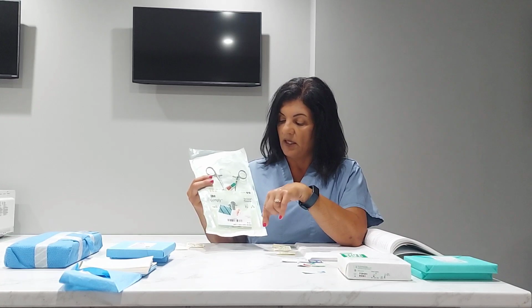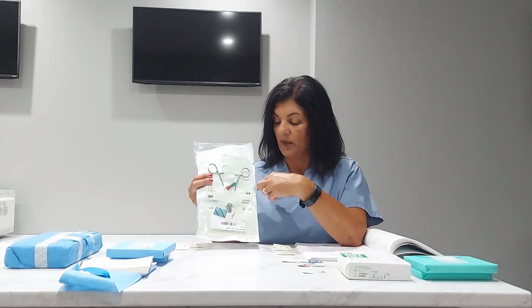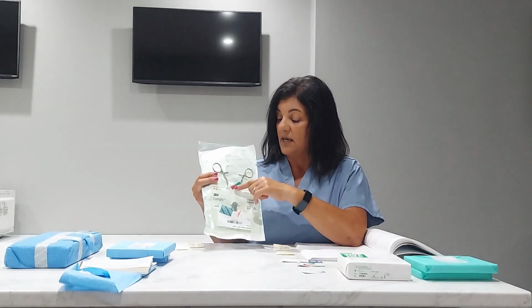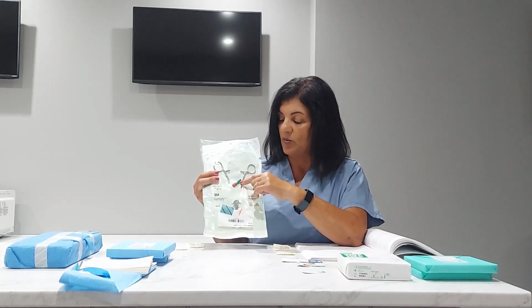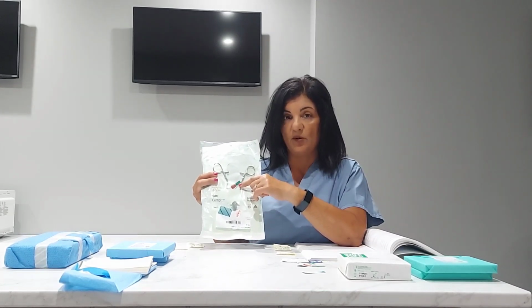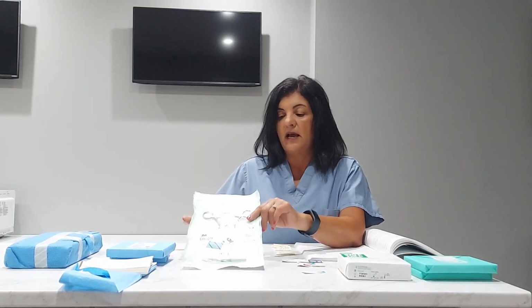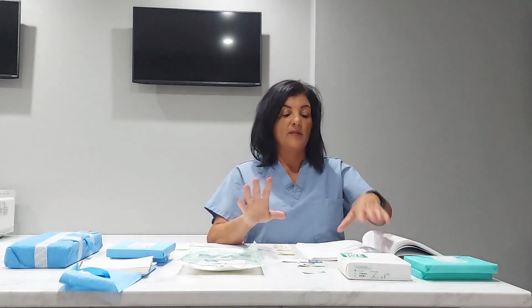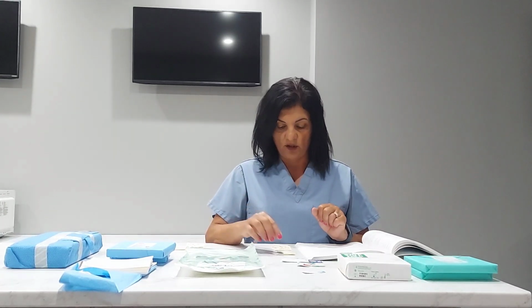My second indicator that this has been sterilized is that these diamonds on this internal card, which is another visual for me, have changed to black. Then my third indicator is that my class 5 indicator right here has changed from white to black into the window where it says it is acceptable. And then of course, I do also see a load sticker, and I would of course look at the tape on the sterilizer, and if there was a biological, incubate the biological, and so on. So again, it's a lot of visual indications that sterilization has occurred.